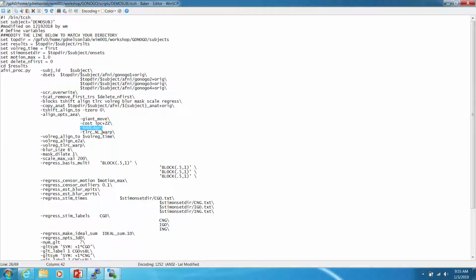And then the last thing it does is it uses this add edge command, which basically gives a little extra space around the anatomical image when we're running it, and gives us some information about alignment later. So the first thing that happens is the anatomical image, because you have to talk about it with imaging of lots of different subjects, the standard procedure is to put it into the standardized space, so you have an X, Y, Z coordinate. So what happens is the TLRC on the structural image is first warped and moved and squished so that it fits a standard X, Y, Z brain.